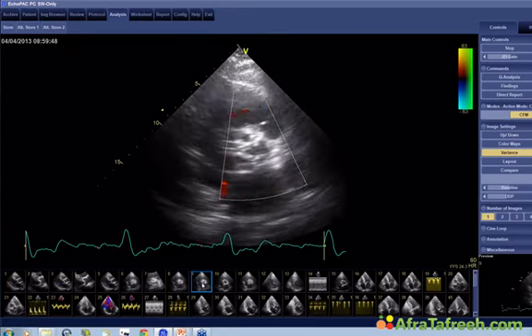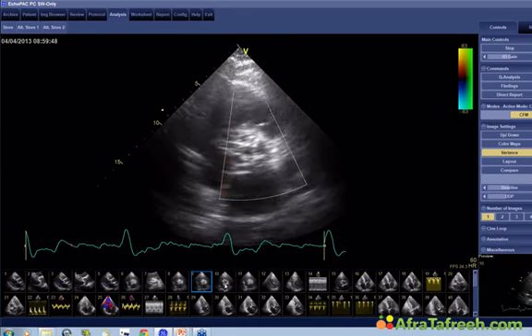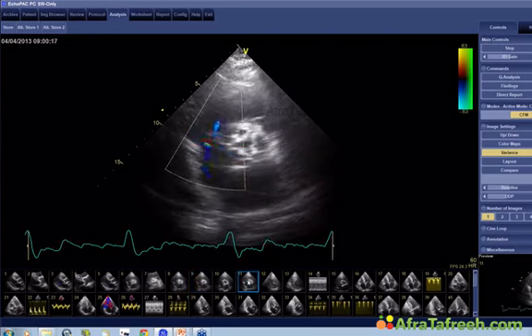Okay, Eleonora thinks that it seems to be severe aortic stenosis. I'm not going to comment on this at this moment because I'm going to ask that later to the rest of you.